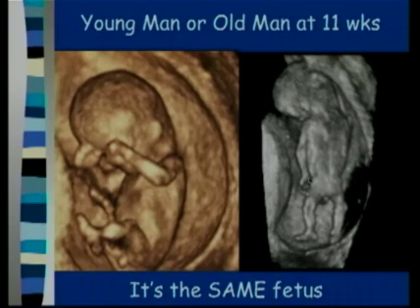But in fetus B, in the picture in B, I think it looks like an old man that looks like he's trying to take a leak and go to the bathroom.